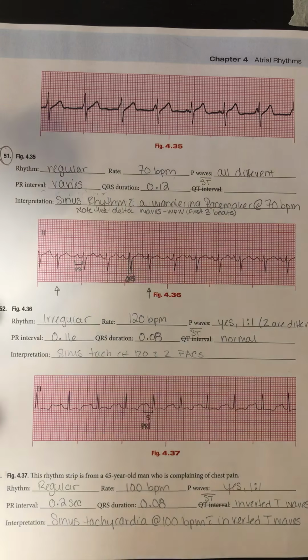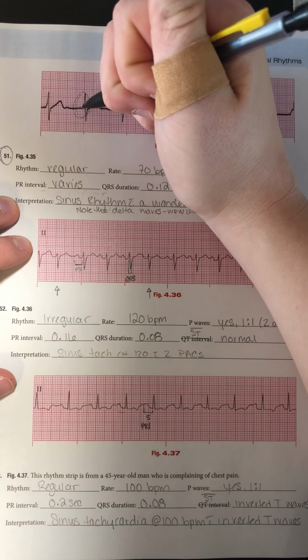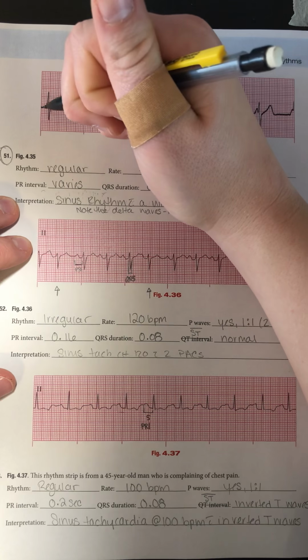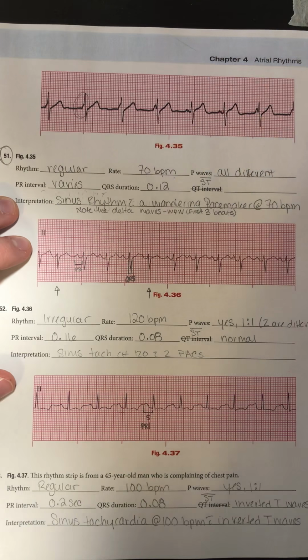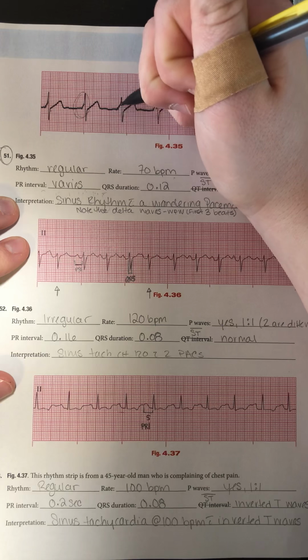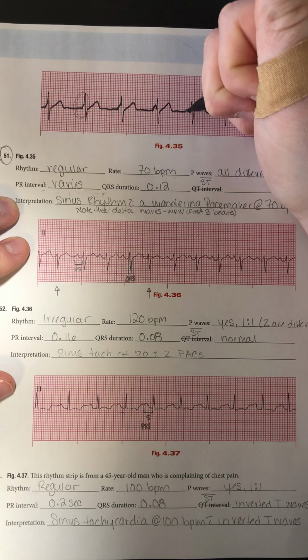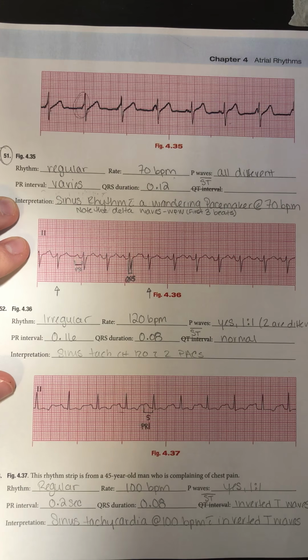And then look at the P waves. So this wave, it's kind of joined right with that QRS complex, this P wave. And that's actually something called a delta wave. Delta waves are seen in a condition called Wolff-Parkinson-White syndrome. You can see how it kind of goes right into that QRS complex. And then we have our P wave coming out a little bit more. We have a notched P wave here, another notched P wave, and then you can see it's going right back more towards that QRS complex.